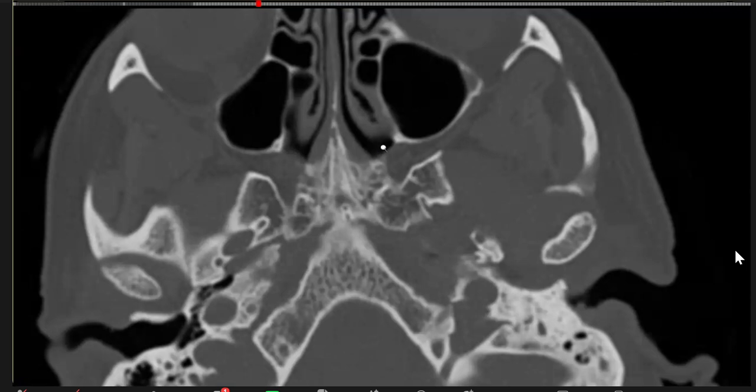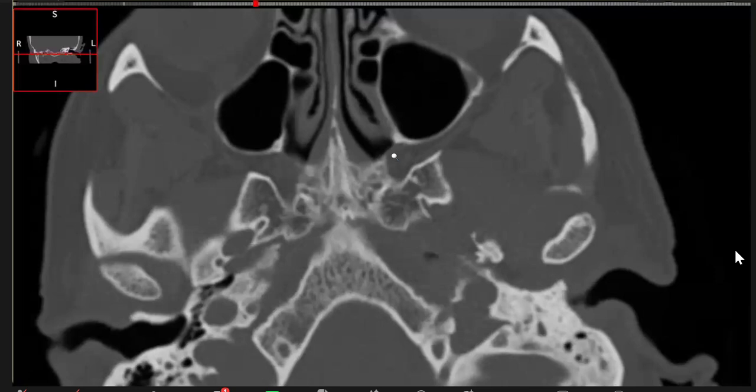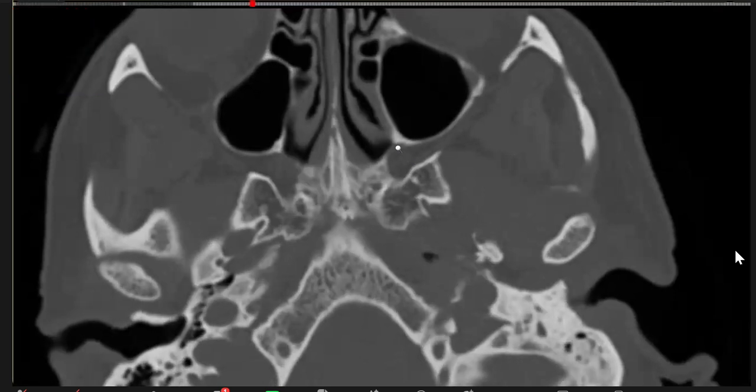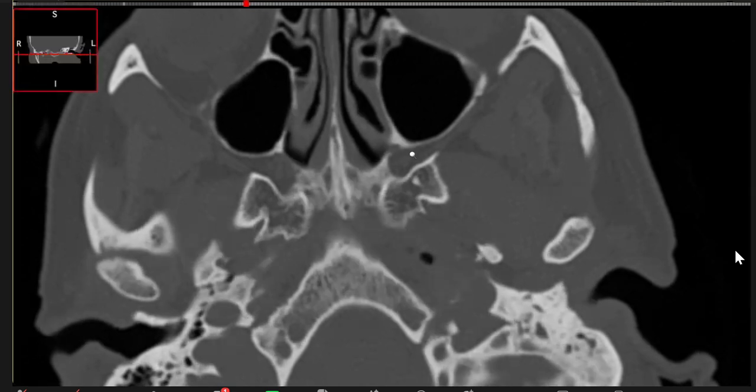And this is why they show you the case of juvenile nasopharyngeal angiofibroma, sorry, which is an exam case. And it actually occurs in the nasal cavity and passes into the pterygopalatine fossa. So one take-home point is that the sphenopalatine foramen is the foramen in between the nasal cavity and this fossa.